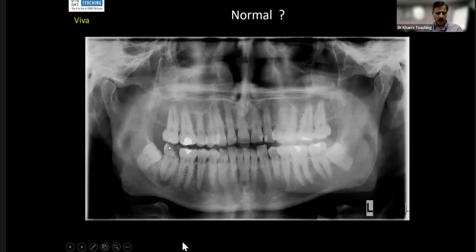Can you describe this for me? This is a spot radiograph of the OPG. There is a similar unilocular non-expansile lucency around the apex of the right maxillary molar. No evidence of any pathological fracture. The bones are normal, so findings are likely suggestive of radicular cyst. And did you mention the crown? Sorry, it's around the apex of the tooth. No, the crown. Did you mention this or you did not? No, I didn't. There is erosion of the crown as well.